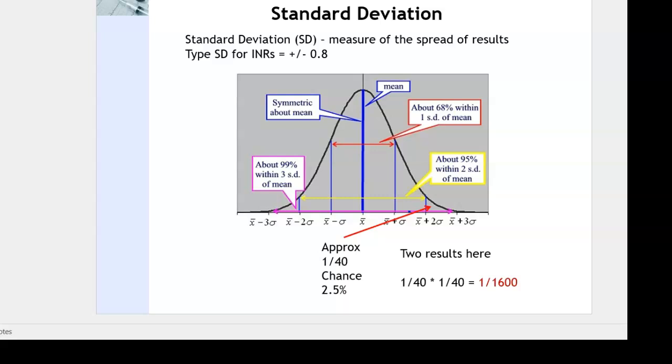As far as intervals go, if the patient is in range, Dawn will extend their interval. If they're out of range, using our latest settings, it will always cut them back to 7 or 14 days, depending on what their current interval is. On our older standard settings, if they were out of range, it would depend on whether or not they'd had a dose change. If they'd had a dose change, they'd be cut back to 7 or 14 days. If they hadn't had a dose change, they would be kept on the same interval.